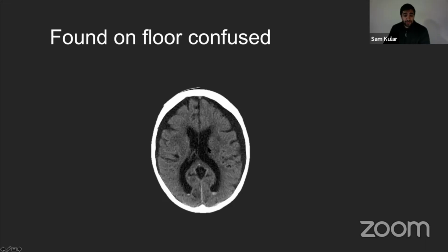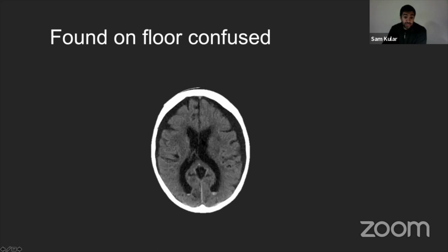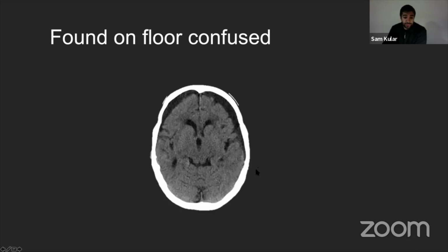And sometimes in cases of low impact or velocity trauma, there can be just a small amount of intraventricular hemorrhage that just shows us a small amount that's confined to the ventricles, and you may not see it elsewhere. So it's important to always assess the ventricular system, not just for hydrocephalus, but in case of trauma for any potential blood as well.